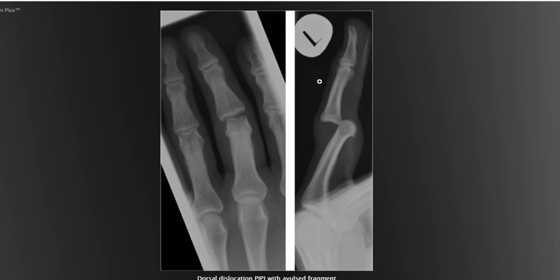The patient probably had a lot of difficulty getting into this position. We can see some kind of artifact here, maybe trying to support the distal part of the finger, and able to get us a half decent lateral view. Initially, at the time of first imaging, we can try and pick up on these small avulsed fractures and little fragments that we can see. Once the dislocation has been relocated, we can further assess for any avulsed fragments once we can obtain a true lateral view of the finger.